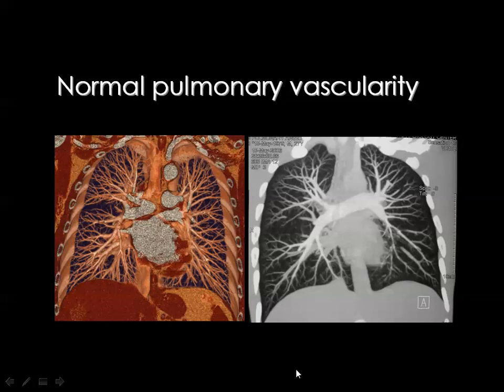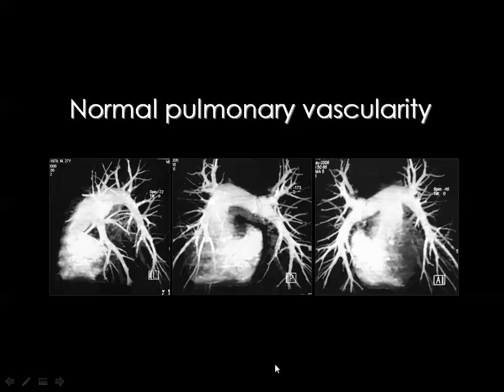Also, you may have these images in color, and you can see the main pulmonary artery, its central branches, as well as most of the peripheral vascularity. You can subtract any of the undesired structures in the image, like the ribs, and you can remove the lung parenchyma, you can remove the spine, you can remove the trachea and esophagus, for example.